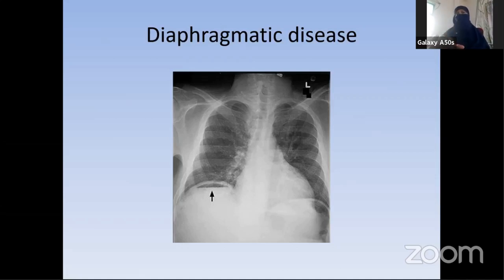If we recall the development and attachment of the hemidiaphragms, the origins of the hemidiaphragms are separate and different. The heights of the hemidiaphragms are different, but you can recall that the insertion of both hemidiaphragms is the same. On both sides, it should be inserted at the same level, and it will produce a clear acute angle with the lateral chest wall.